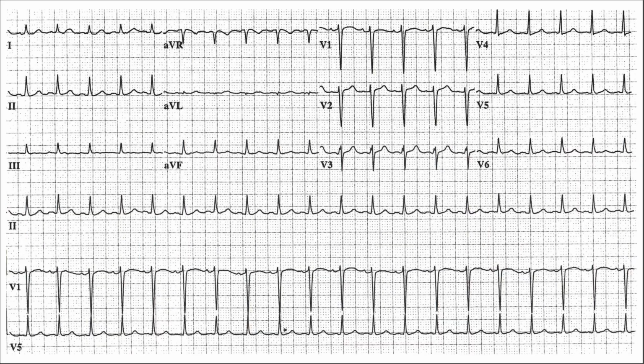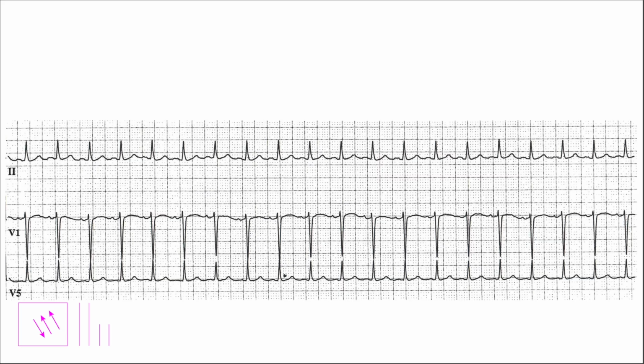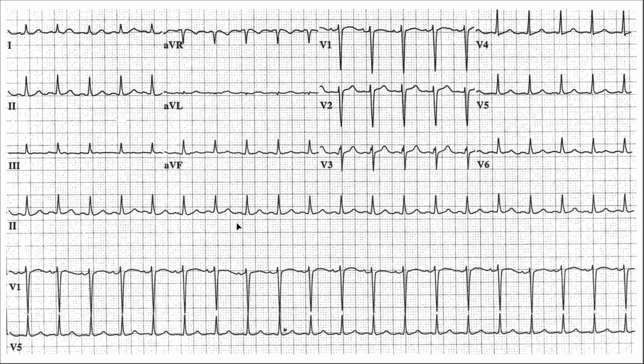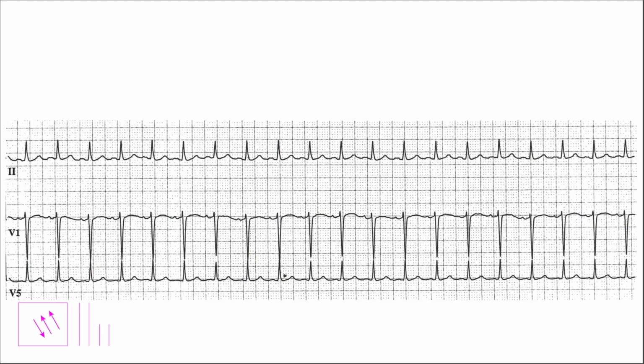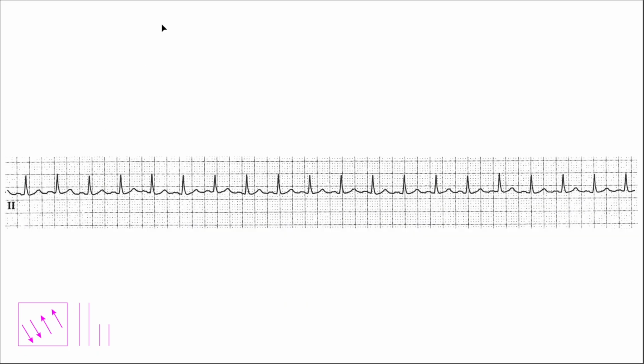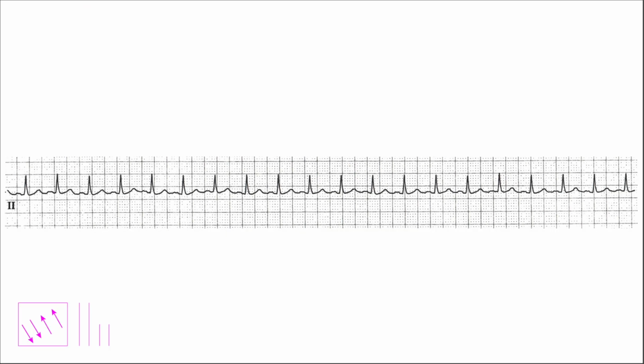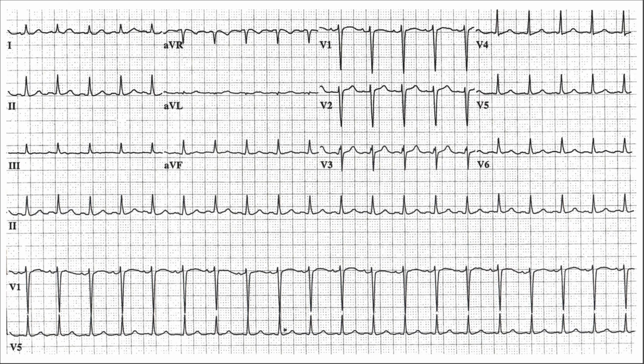Today we're going to be taking a look at this 12-lead ECG. We are going to be breaking it down and building it up, starting with a single channel and working all the way up to the final 12-lead channel. You can see the difference in working in telemetry versus working in a clinical setting, that is, looking at a single channel and taking a look at a full 12-lead ECG.